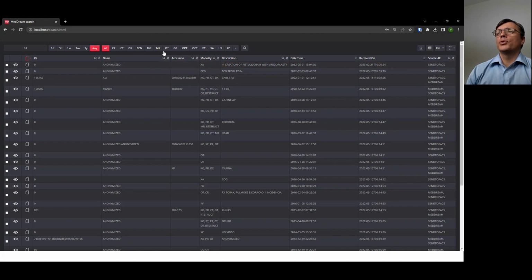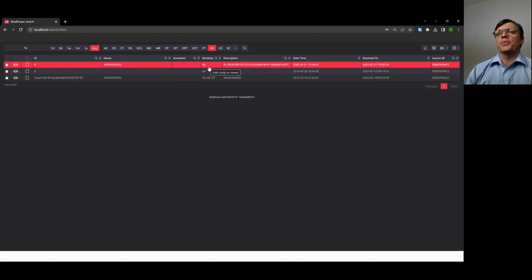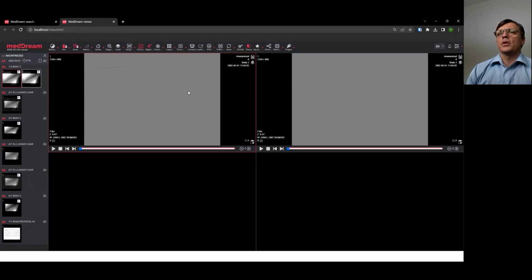Now I will move to a feature which I really expect to work, angiography. When I click the angiography image, we can see that the angiography is already created. And now I can switch and show the view. Of course, because this vessel is already in a very bad condition, almost no blood is going through the vessel, so it's harder to see.